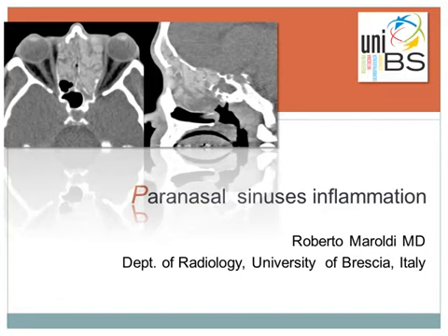Now we are focusing on paranasal sinus inflammation, a condition that can include lesions ranging from mild involvement of the paranasal sinuses with inflammation of the mucosa, to lesions that are able, like the image you have in front of you, to produce enlargement of the ethmoid cells and displacement of both globes. You understand that this is a condition that will require a precise evaluation by imaging.